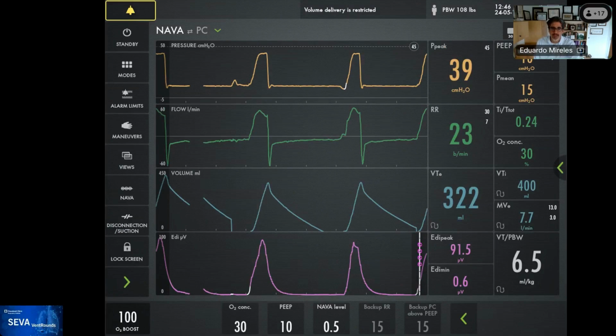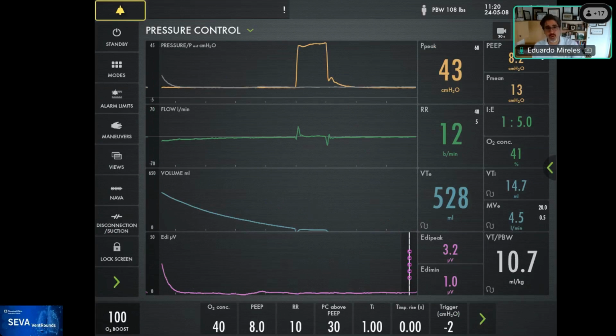So I thought, oh, and here is just for your viewing pleasure. Again, no activity, you see the breath, and you see how the ventilator doesn't deliver anything. And I see this relatively often in obstructed patients. In this image you can see the peak pressure was 43, so the ventilator was really pushing pressure in, and the patient didn't get anything. When I see this, you need to uncover the patient to look if there's activation of the expiratory muscles, which was the case here.